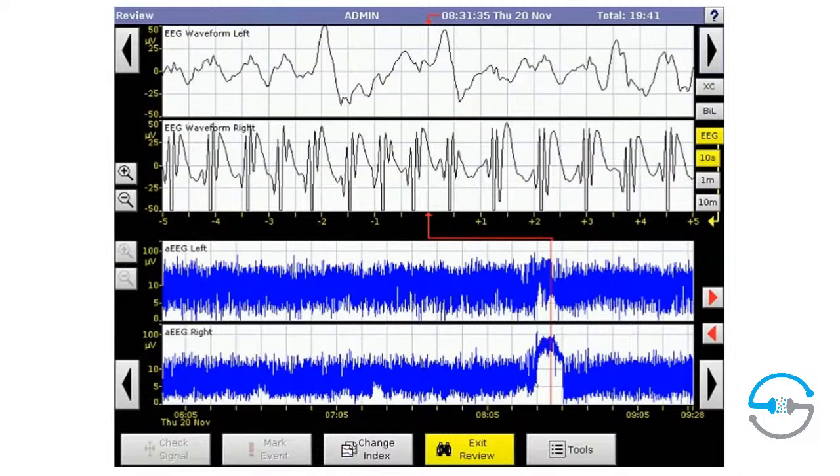So as the voltage of the seizure begins to increase, we begin to see an uprising of the lower margin. And then not until we get almost here a few minutes into the seizure does the upper amplitude also begin to be influenced. And as the seizure continues and becomes more rhythmic, the differential between the voltages of the seizure becomes smaller and smaller. And this is what causes the compression or the thinning of the aEEG band.